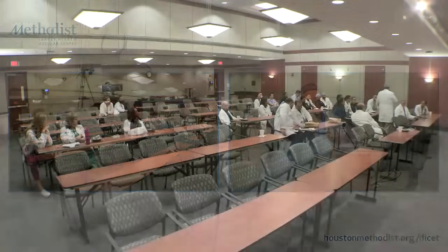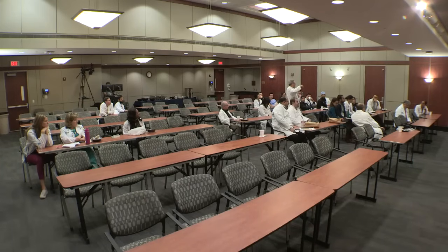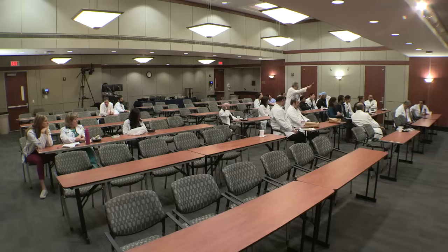TEE versus ICE. Sounds like a lot of what you show with ICE could be done with TEE. And I have heard speakers in other conferences where they say that they have almost given up on transthoracic and they do TEEs for everything. For us, it would be a nightmare. With the number of LVAD echoes that you guys order, the TEE lab would be flooded. Just need a probe there. But the question is, what makes you go to ICE versus a TEE? Or is it just convenience because you're there in the cath lab? So I think convenience for sure.